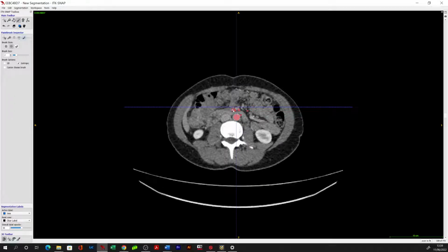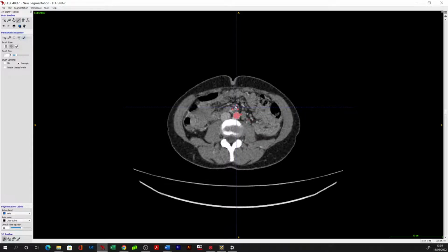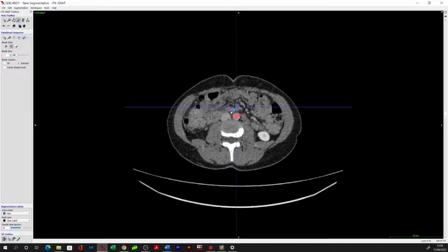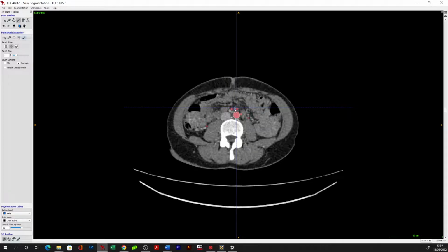And here we're seeing the ileocolic vein emerge from the SMV. You can follow this down a little bit more, and you can see that this is starting to bifurcate. Oftentimes you can see the terminal portion of the SMV terminates into 3 terminal branches which drain the ileum. Very occasionally, you may see that the ileocolic vein inserts into one of these terminal ileal branches, as opposed to the typical draining location of the SMV.